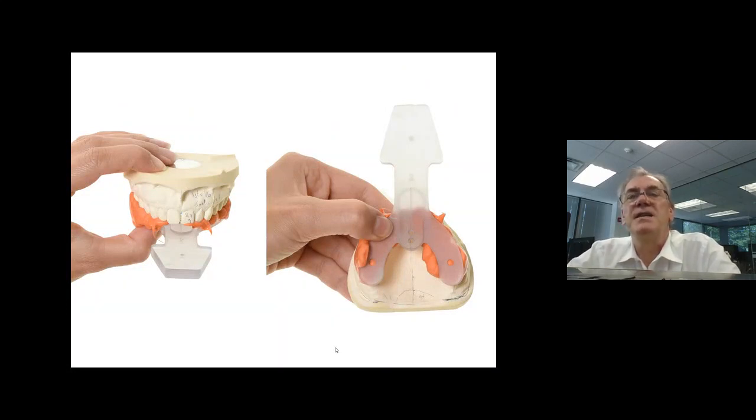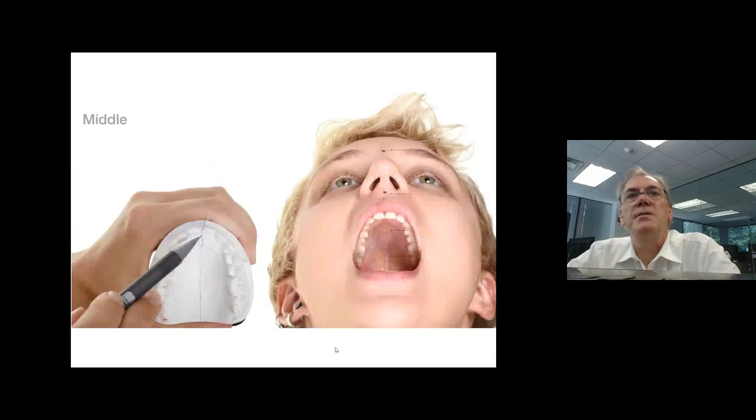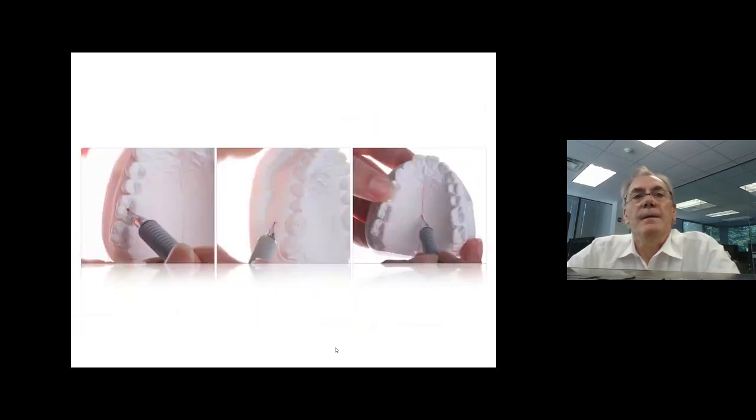So basically, it's a physical procedure in mounting the models in an articulator. We determine the actual midline by locating the midline seam on the model. We need to know the distance between the first molar and the hinge axis, and as we mentioned last time, it is 90 millimeters.